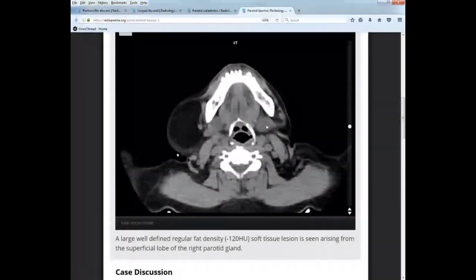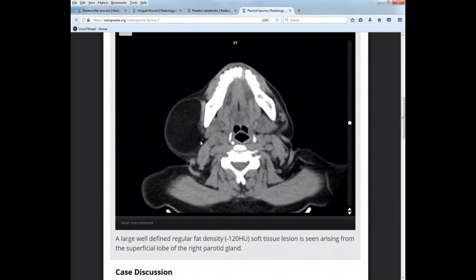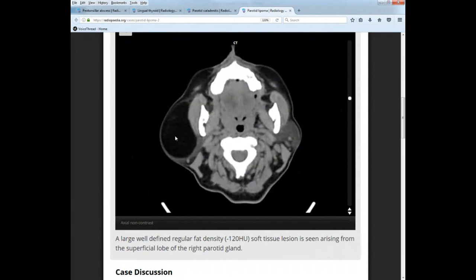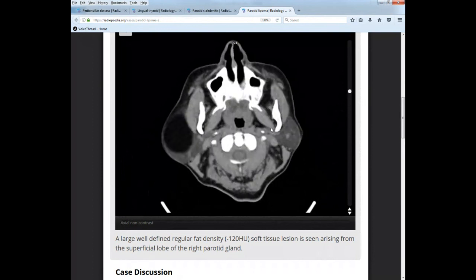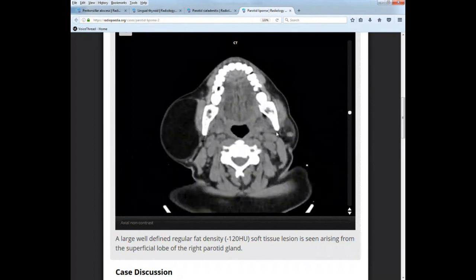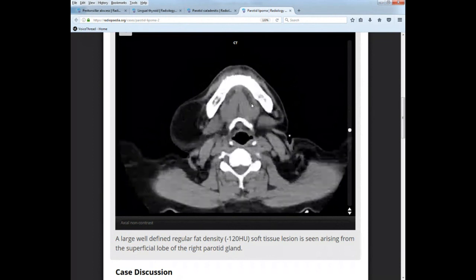Let's look at the parotid lipoma in an axial view. So lipoma is this like fatty growth on the parotid gland. So we don't quite have a normal parotid gland over here. Here's parotid gland over here. And this guy, even better, you can see how it looks totally different than the submandibular gland, which is in here. Where is it? In here. This guy here and this guy here. And then the sublingual, you can see them in here.